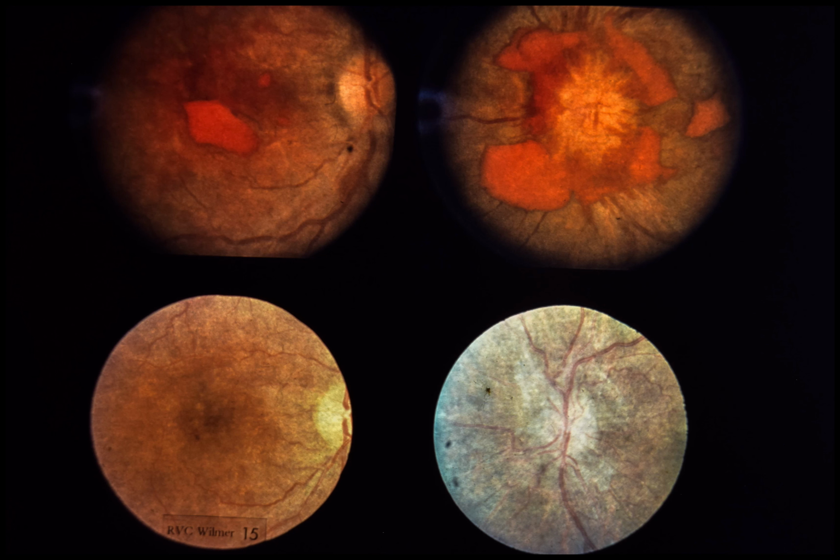Cerebral angiography showed a right middle cerebral artery aneurysm that was clipped 2 weeks later when the patient's condition was stable. Lower left. 3 months later, the right macula is normal except for some minimal pigment epithelial changes. Lower right. 1.5 years later, the left optic disc is no longer edematous, but shows mild atrophic changes. Visual acuity is 20/20 right eye and 20/30 left eye, with mild constriction of the left visual field.